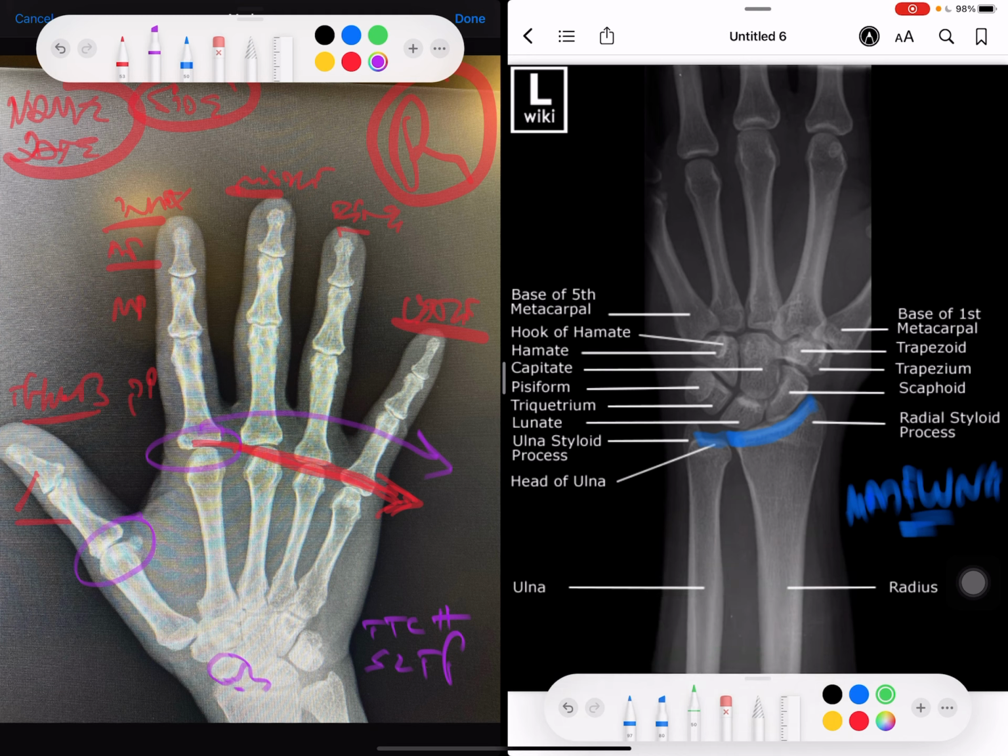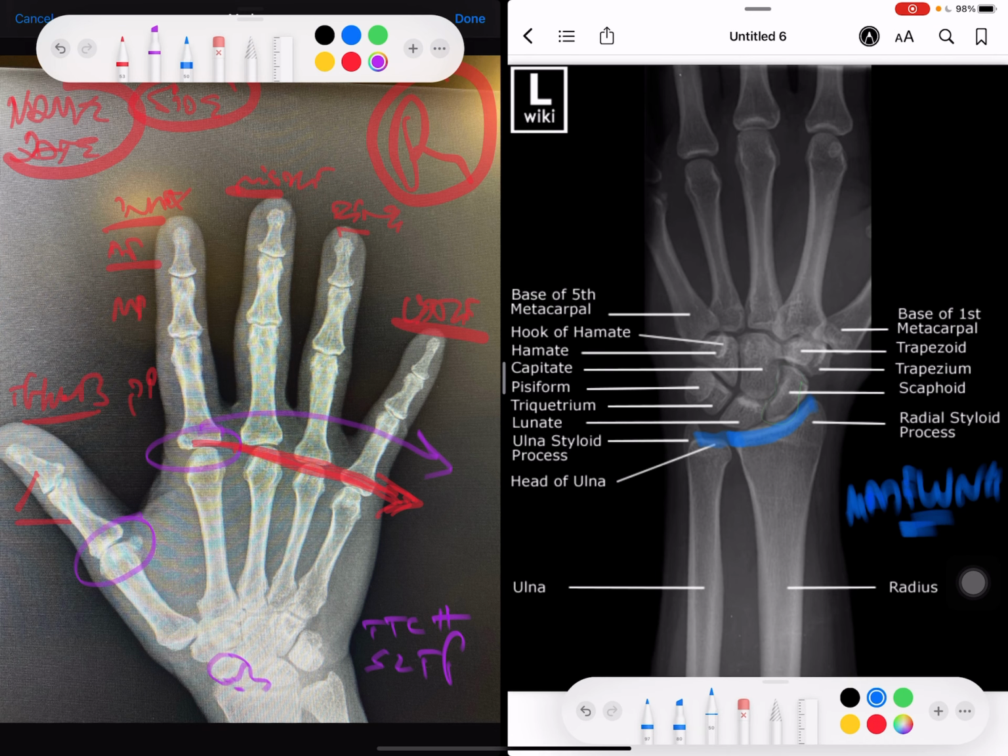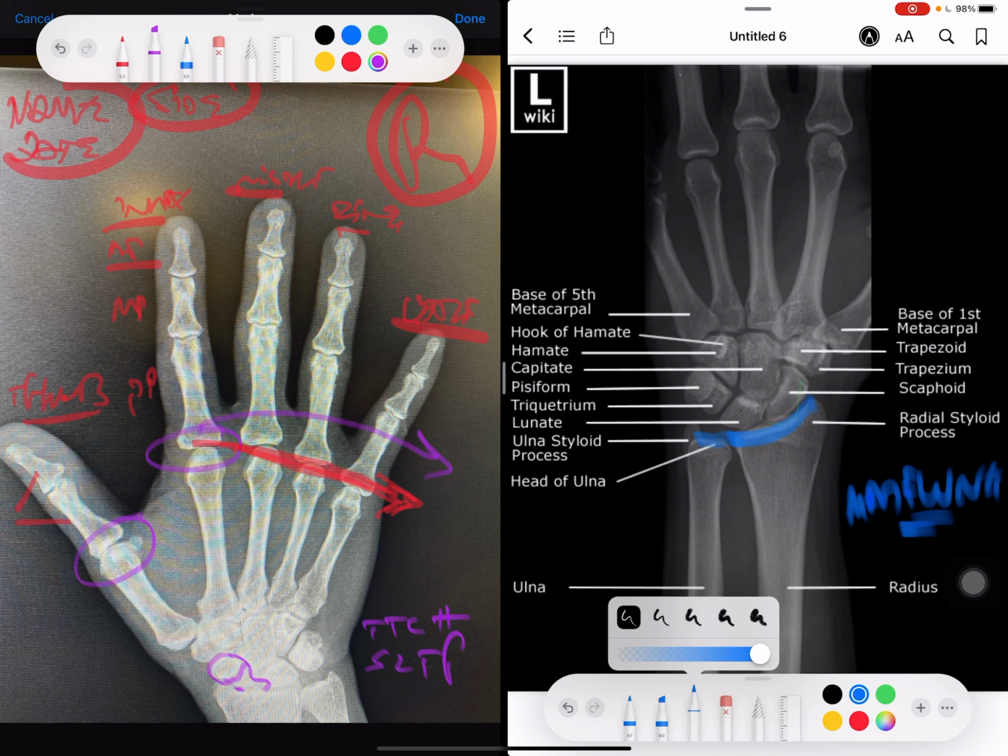That's good. So scaphoid, yes. It's so hard because it's opposite. It's left. Yeah, left, that's right. I'm just going. So scaphoid. Oh, we use red. Yeah, you need to make it darker. Yeah. So let's use red.